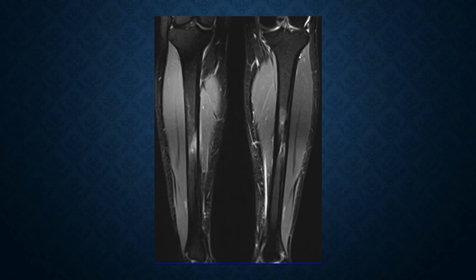Here's another slightly differently weighted coronal T2 tib-fib MRI. We can see the fluid inflammation that will appear white against the darker shaded bones. The patient's right tibia shows a more advanced progression of bony stress than the previous slide, with edema that has started to penetrate deeper through the bone.